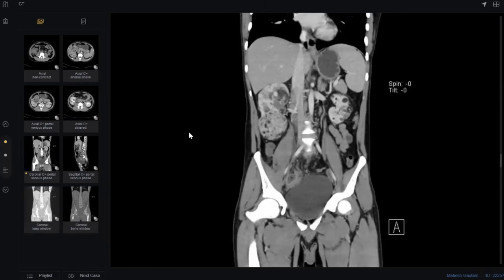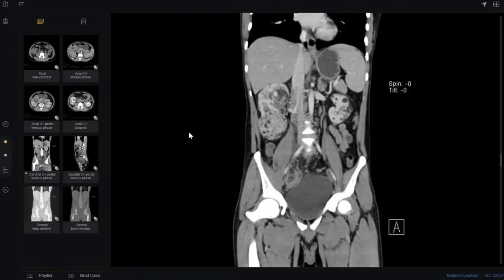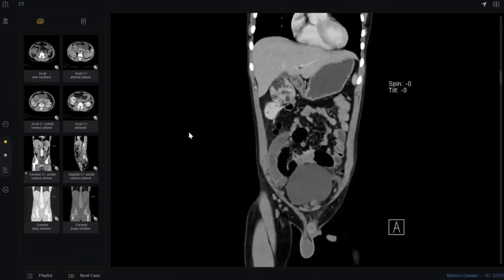And what is your next step, please? I'm not able to see that. Could you please scroll that region once? What's your final diagnosis? So, yes, I think this is in keeping with an appendicolith in the dilated appendix. What's your next step? The patient is having appendicitis as well, so this patient will need urgent referral to the on-call surgical team.